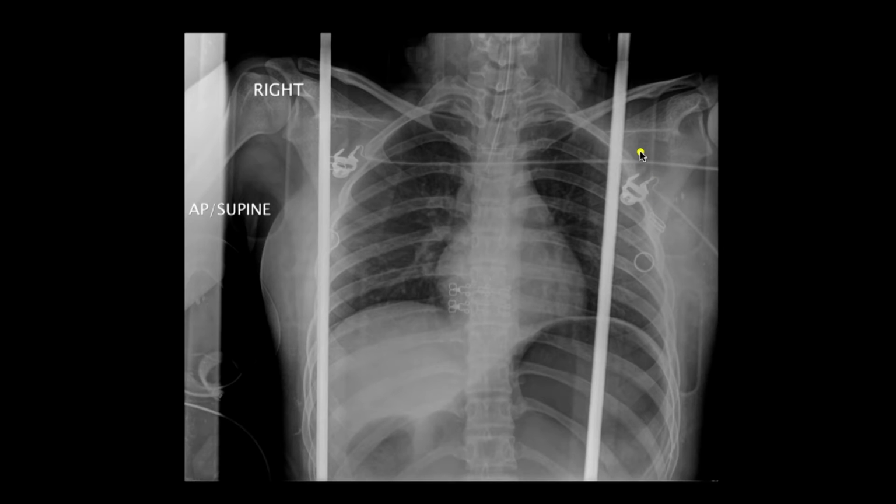Fantastic. In this patient, you can see the endotracheal tube is deviating to the right, which makes you wonder whether it could be going into the right mainstem bronchus. However, what's important in this example, you can see that there's extensive gaseous distension of the stomach, and so this is concerning for an esophageal intubation. So even though sometimes it may look as if it's in a relatively good position on the chest x-ray, if you see a telltale sign here, you want to make sure that the endotracheal tube is in the right place and not within the esophagus.